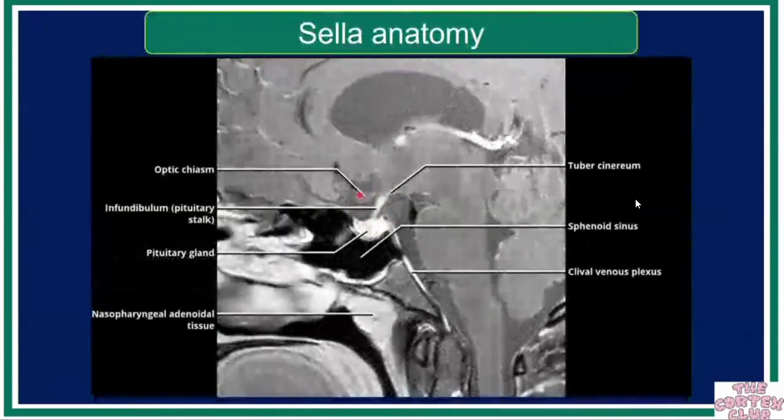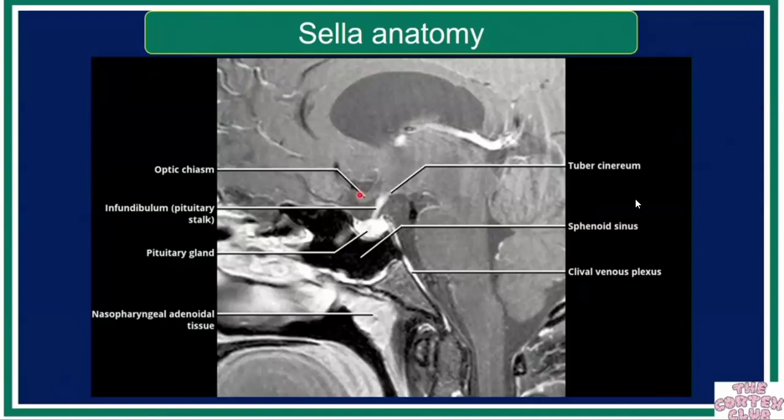And as I said before, on a post-contrast T1 weighted image, the sella or the pituitary gland actually enhances because it is outside of the blood-brain barrier. Normal brain structures do not enhance because there is a blood-brain barrier which stops the entry of contrast in the brain tissue unless there is a disease. Of course, if there are tumors, if there is an infarct or other diseases, that blood-brain barrier is disrupted and those things enhance. But the pituitary gland and the pituitary stalk, because they're outside of the blood-brain barrier, normally enhance. And this is what we see.